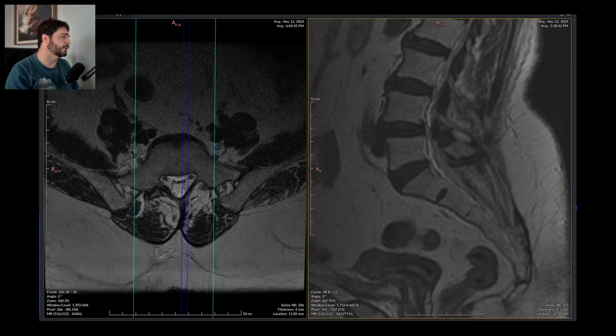No stenosis, just hypertrophy of the muscles. Just severe arthrosis. Right there. Fine. Did I miss anything? No. Just that. And we are done. We are free.